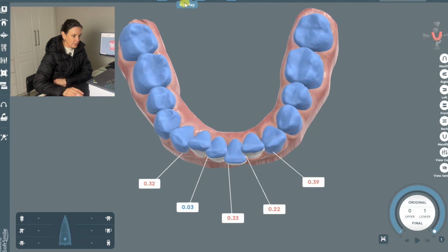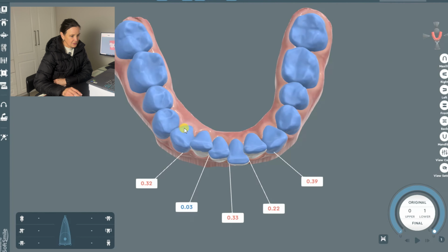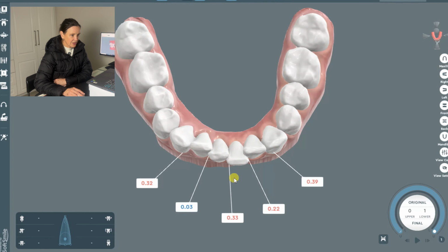They can either splay if you've put them too far forward, or they just are going to go back because of the force application on them. So my aim is always to try and see, can I stay in that trough or that line where they've been? So now I'm going to choose myself a tooth, a reference point, and I like that one. That's maybe slightly forward. That in terms of position is maybe better, but that's going to be a hard one.